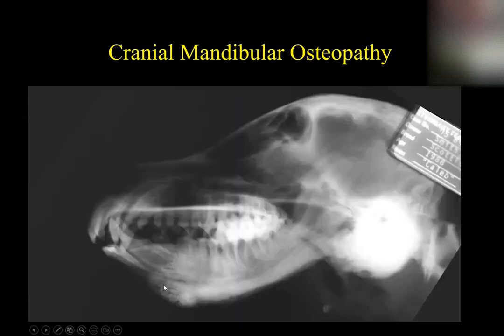On a real radiograph, this is what you see. Here's a lateral view. We see all of this bony production along the ventral aspect, very irregular in shape, and it becomes really severe, really obvious. But it's symmetrical. The right side looks just like the left side. There's absolutely no bony lysis. Nothing's destroying or eating the bone away. It's just bony production along the ventral aspect of the right and left side of the mandible that's symmetrical. Then all this bony production can extend up to the region of the middle ear, the tympanic bulla, and sometimes it will also involve the temporomandibular joint.